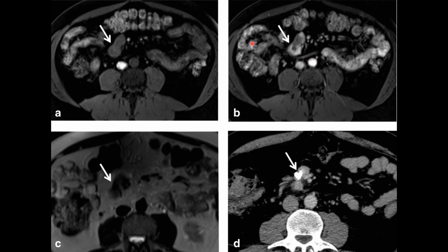And if you see, the third image is a T2 weighted image itself, because we can see here there is a bright CSF. So we had the T1 image which is isointense, which is showing avid arterial enhancement. If you see the T2 weighted image, again there is a slightly hypointense lesion, but what is clinching here is this dense calcification present here and slightly spiculated margins.